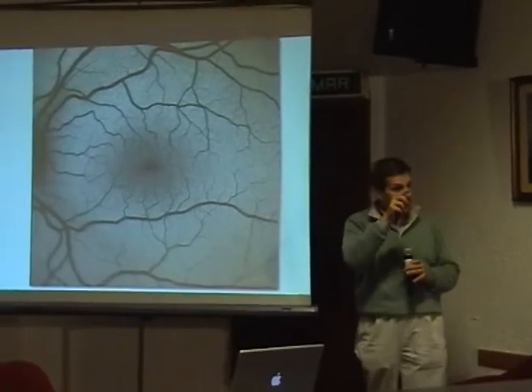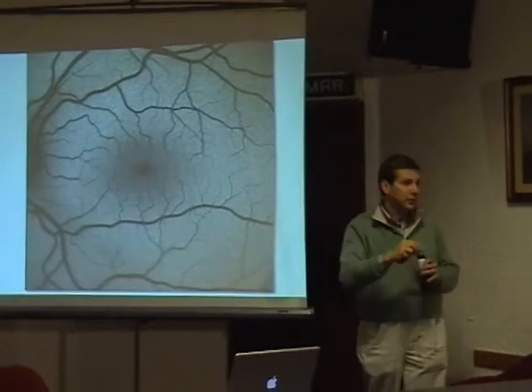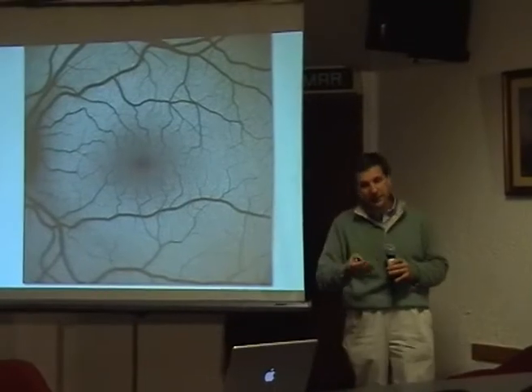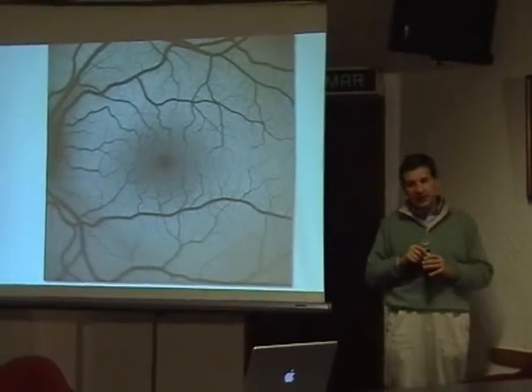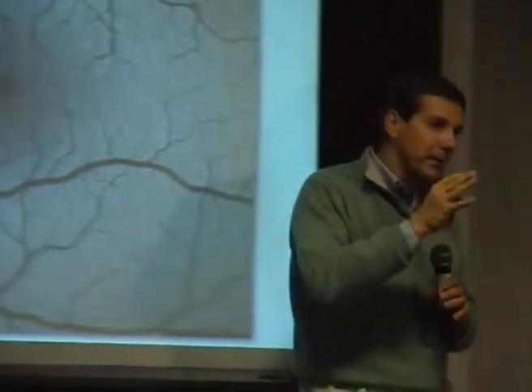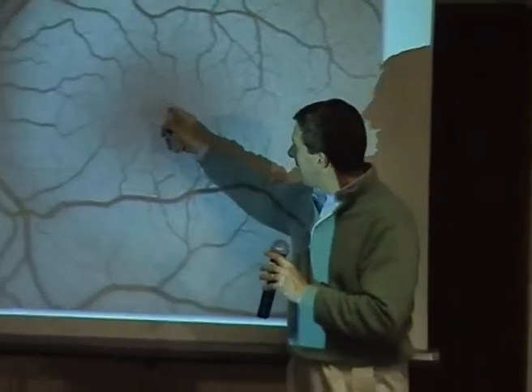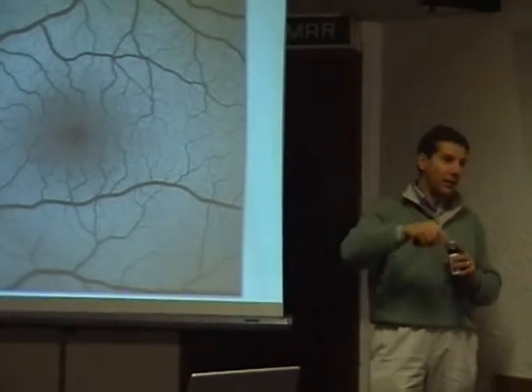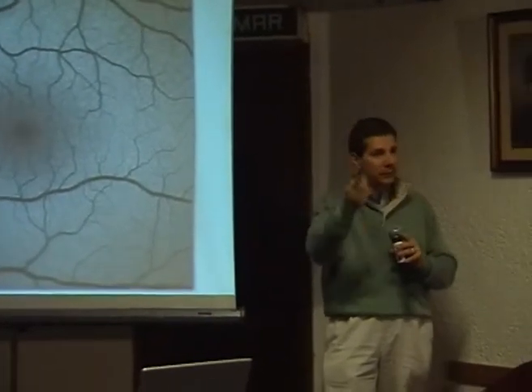So indirectly you can actually see how much extension you have in macular pigment, and in fact there is a study that I did with Francois Delori in Boston that shows that there is a difference between male and female in the distribution of macular pigment. It's not clear why, but you have an annular increase of fluorescence in female and not in male.